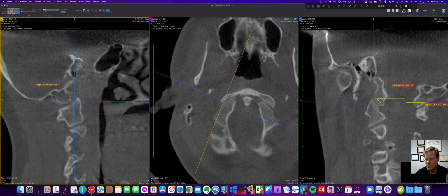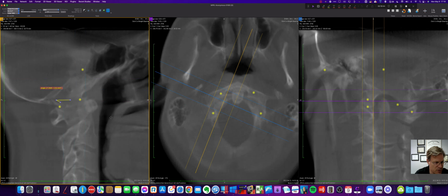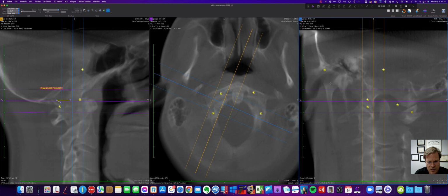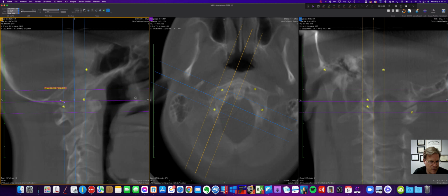Now, what I want to do is take a look at this outside edge. It was difficult to see with a thicker slice, but that's how Dr. Blair did it. But you get more resolution on an x-ray, although I'm not sure about the x-rays he was using. They're pretty old. Probably still better than this. So here we are looking at pretty much the full joint. There's a little bit that's not there, but I'm getting all this outside edge. And so I can't really see what's going on here, but since I've already got my measurements, I'm not too scared about actually moving things around.